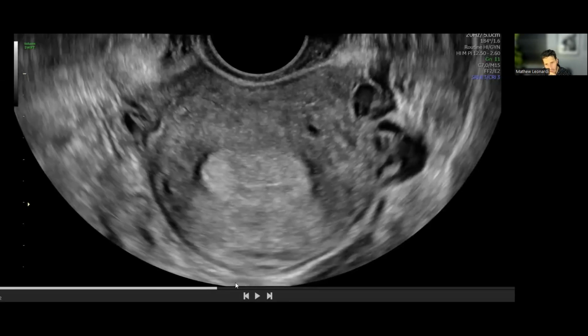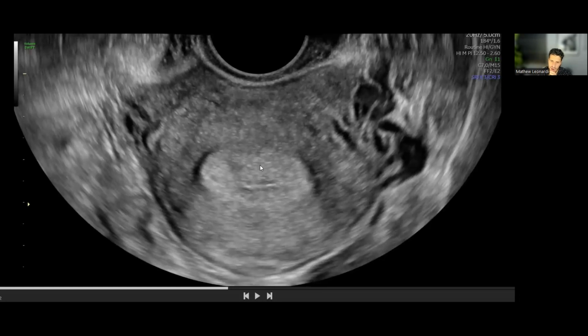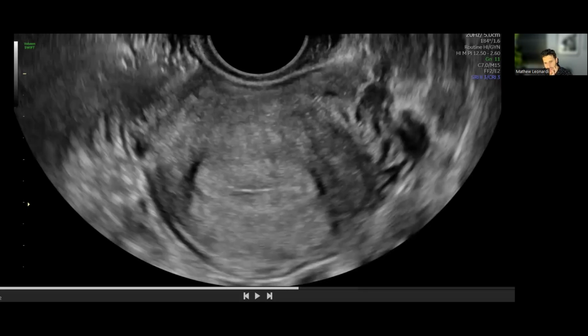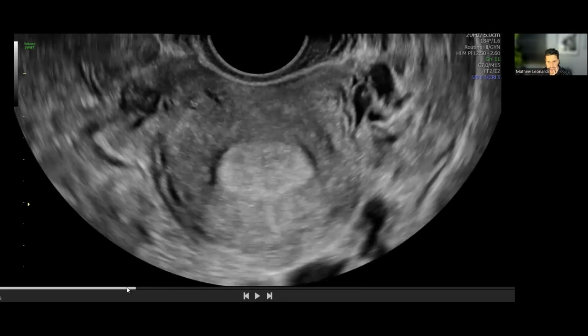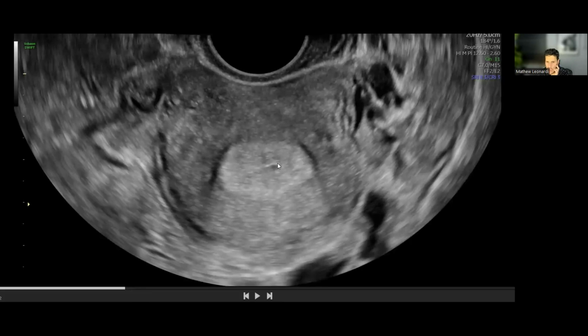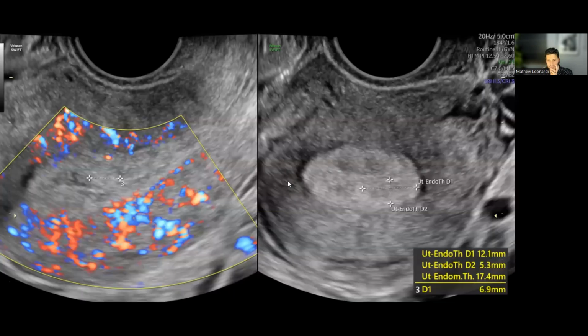So I'm thinking more right here is where that polyp is. I think it's anterior because we know it's distorting, displacing that line posteriorly. So I think that's the area of focus. Though for what it's worth, what I'm also seeing here is a little bit lower. We're seeing a bit of maybe an anterior displacement. So could there also be something here which looks like that area that might have been measured?